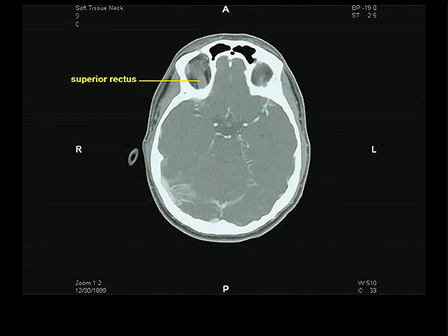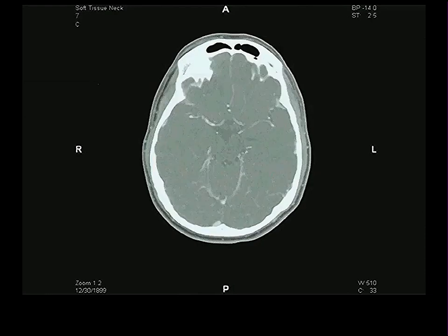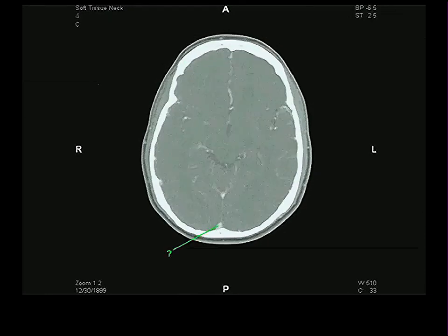Superior ophthalmic veins, they never look like anything in the section. They look like a piece of stuff. It's a real thing that you can pick up in your forceps that runs front to back inferior to the superior rectus. I don't care what it looks like. That's what the superior ophthalmic vein is in dissection. And now we're just getting to nothing very interesting, brain, and things like that, which don't do much for me.